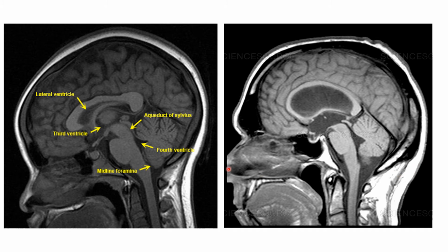Okay, apply basic knowledge here to there. So dilation of the lateral ventricle, the third ventricle, and here the fourth ventricle. You might find it difficult in the assessment of the fourth ventricle. With experience, you will know how to say if this fourth ventricle is dilated or not. Okay, but in this sagittal cut, we see the lateral ventricle is dilated and the third ventricle is dilated. So this is communicating hydrocephalus.